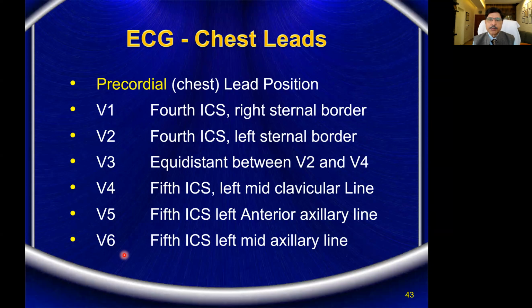Now we go for rate determination. It's a very simple approach I'm going to tell, and of course, you can also calculate it from the ECG. That's not a very difficult thing. So let's continue from where we left off, and let me share the presentation again. We have two important things to do, the rate determination and the axis determination. I'm going to show you a very simple approach for rate determination.